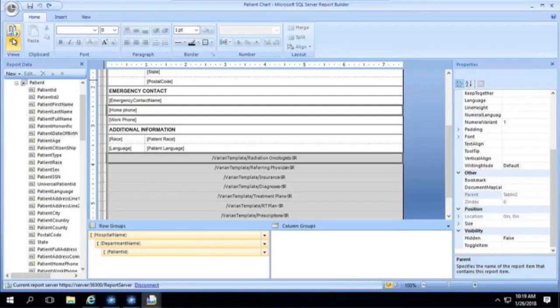Okay. So let's say I've gone through and I've done some editing in my report, but now I either need to get back to treating patients, or it's end of day, I need to go home, or I just want to take a break from the report and come back and look at it later. Right? Now we all know that when we log into ARIA, it's very much user specific. Well, that follows suit with Aura. When I log into Aura and I go into Report Builder, either create a new report or edit one, it is very important that you log in. You are the one that's logged into ARIA when you actually go to create that report or edit one.